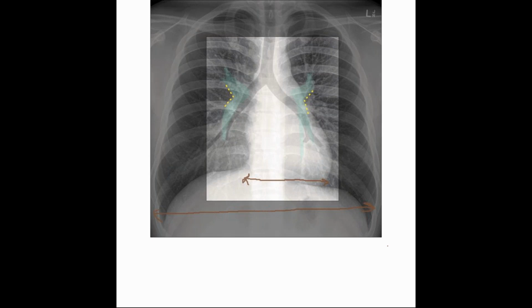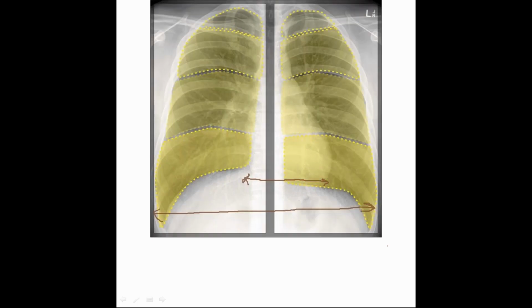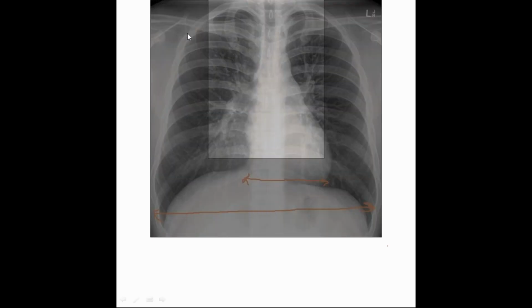And the fractures would include a clavicle, which is visible, or you will see at the rib cage. So this is the clavicle on both the sides. You have to see the rib cage. That is what is visible as for the fractures. Markings, I am not getting. What are you asking?